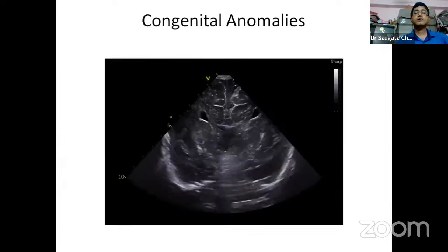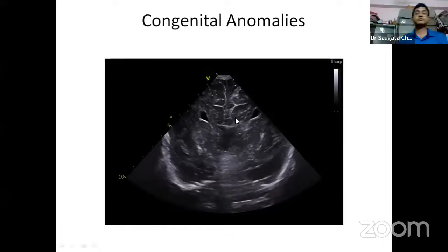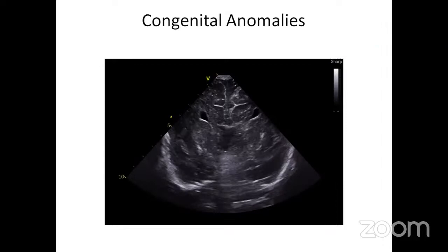So here again, can you diagnose this case? Please write in the chat box. This is a congenital anomaly.